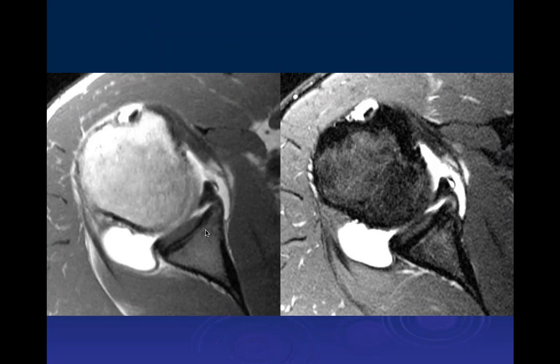Here are the axial images, again, where we can see the full thickness defect, in this case on a little different plane of the articular cartilage, another articular cartilage lesion associated with a tear. Remember, you should not have contrast going beneath the labrum below the equator. And so this is an anterior inferior labral tear. The periosteal attachment is still there. And I do believe there's some bone injury here, as well as a fracture going through the articular cartilage. So another so-called GLAD lesion.